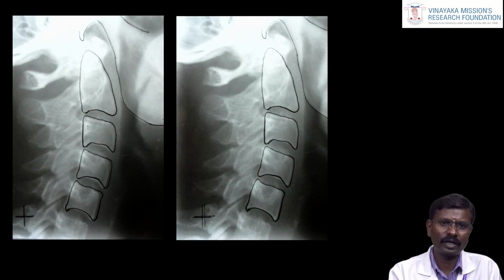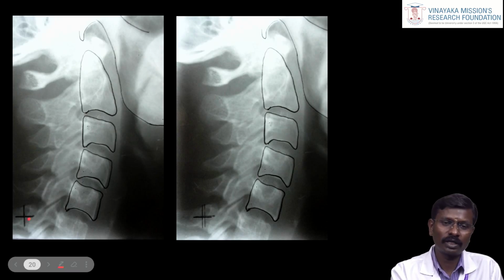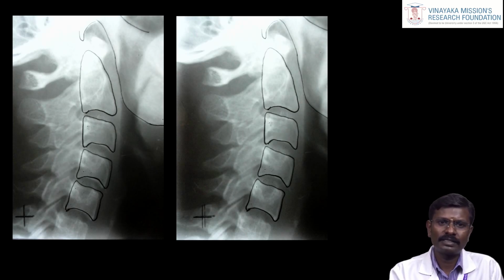Here you can see 2 drawings of the vertebra. On the left side, you can see that the marking is the same; both the marking on the film and on the tracing paper are the same. If you look at the right side, there is a movement. If you didn't notice this, and you mark all the anatomical points and take the values, you will get a misreading, and you won't get proper diagnostics from that calculation. So this is the most important thing when you are doing a hand tracing.